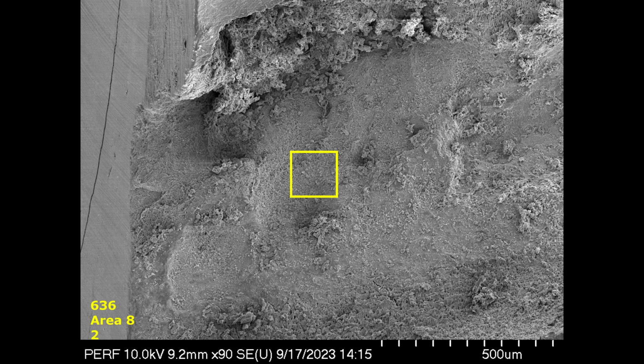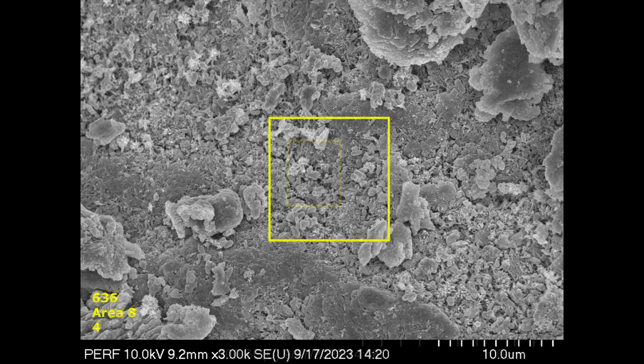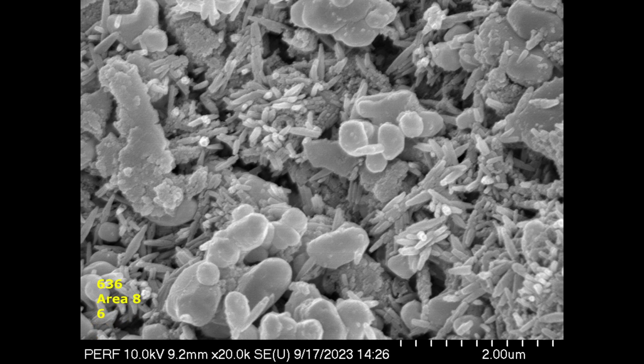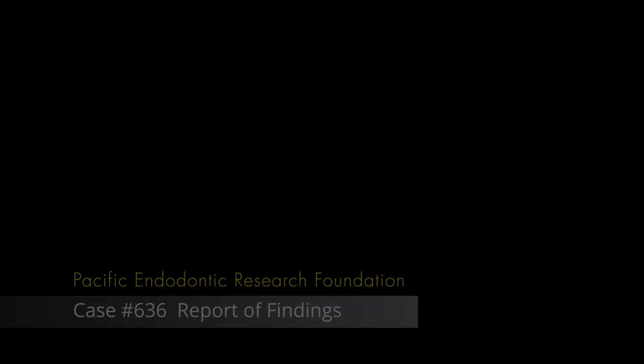It was not demineralized at all. So as you go through the high-resolution pictures in the Google group, you should take a close look at this because it is interesting to see that the peritubular dentin is intact and a lot of demineralized dentin is sitting there along with the microorganisms. So if there are any questions, please feel free to contact me in the Google group.